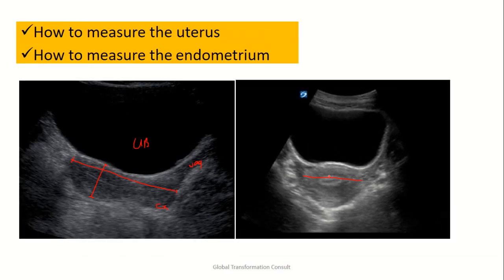So this is how we measure. We measure from here to here, and from here to here. We measure inside to inside, not the outside of the basal layer, but the inside of the basal layer to the inside of the basal layer.